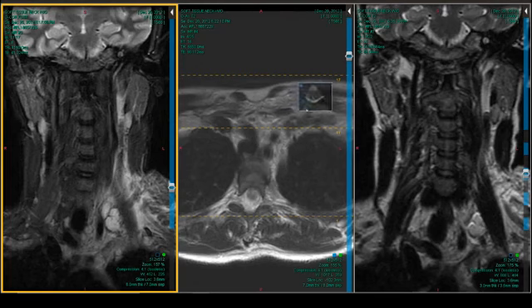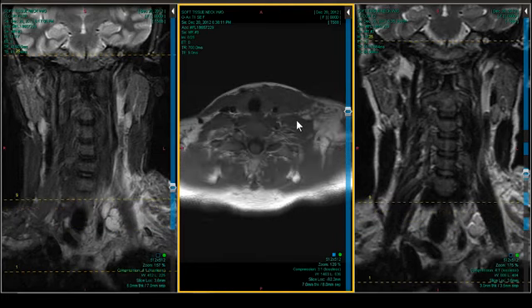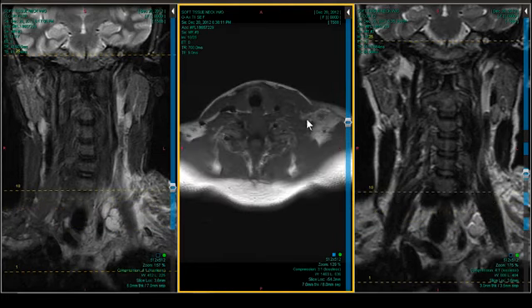So let's pick up the T1, because we now know that the T2 is going to be unreliable. So let's see if we can get some more reliability. Now, on a T1 weighted image, I do not want to see gray signal in a vessel, a vein, or an artery. White signal, okay. In-plane flow entry, slice entry phenomenon, first described by the esteemed scientist and radiologist, Bill Bradley. But it's not white, is it?